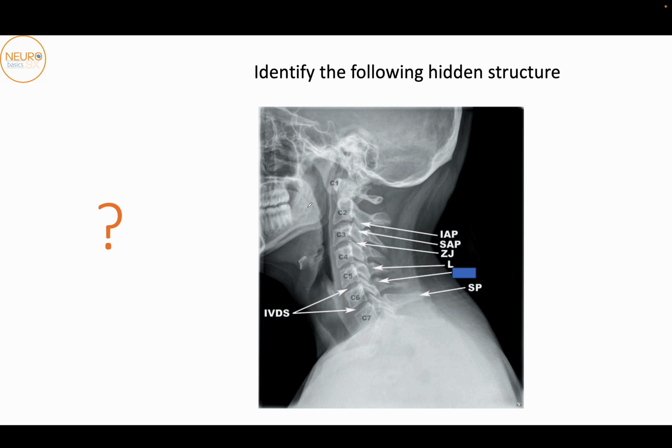So we'll just go through a few questions. These might be slightly more difficult, because we have not discussed them during the seminar, but I'm hoping we'll be able to get these. So can we identify the following structure over here? Okay, but we'll also go through what are the rest of the structures we can see. You can leave the answers in the chat box.